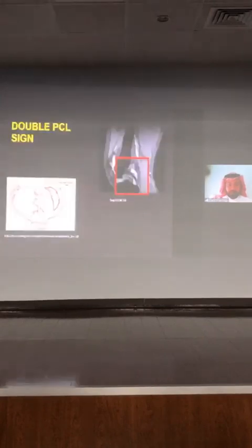Now let's look at it on the coronal plane. I'm going to show you a number of images through the coronal sequence so you can understand what we see, and I'm going to highlight the flipped fragment with this orange color. Now we are at the anterior aspect of the knee. This is the medial, this is the lateral, this is the femur, and this is the tibia. This is the fragment that is flipped, and we can see it again over here. This is the parent medial meniscus, the part of it that stayed in place, and this is the flipped fragment.